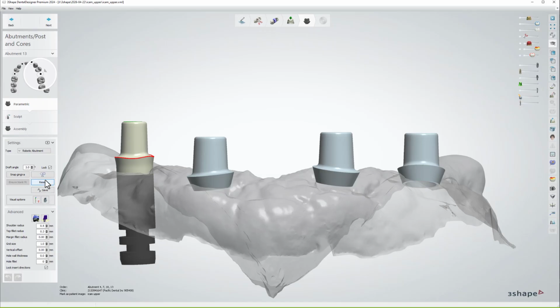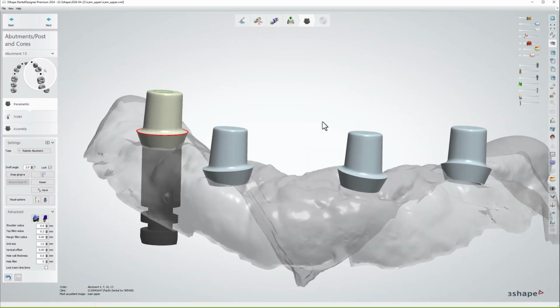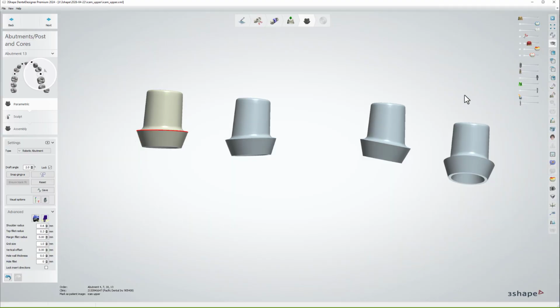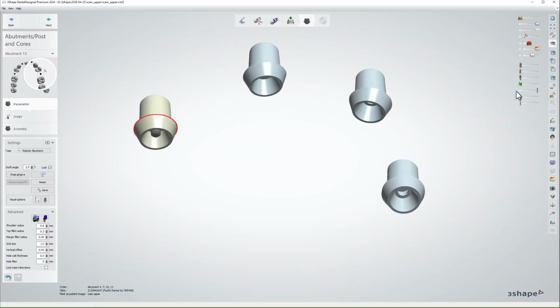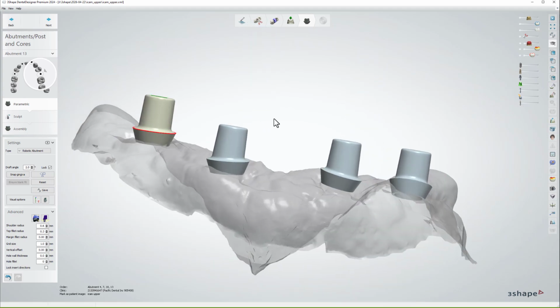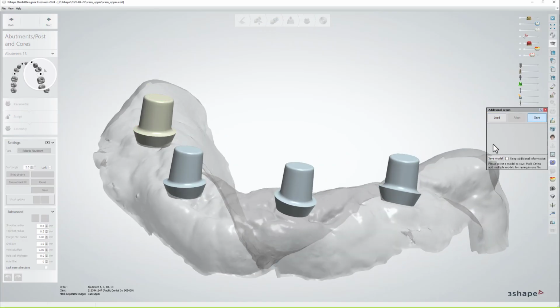Again, this is just for shiggles. This is how I test. Hey, can this, what happens? Can I switch between libraries? What's going to happen? Is it going to be off? I will tell you, the accuracy will not be off as far as where each one sits, because that is in the Icam data.